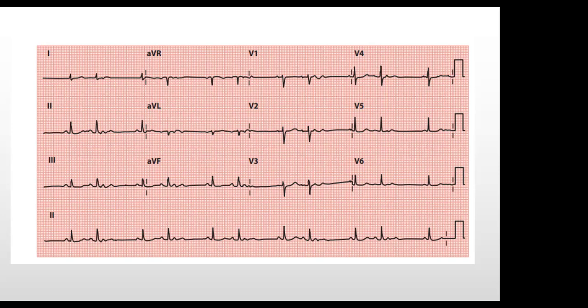Okay, let's hear from someone else. Let me try. I think this is Mobitz type 1 AV block, evidenced by the first bit: when you look at the PR interval from the first and the second beat, the second one appears prolonged. Then after the second QRS, there's a deflection which I think is a P wave, and that is not followed by any QRS.